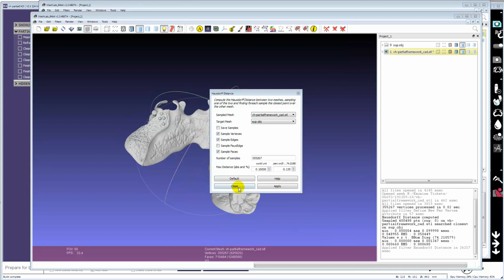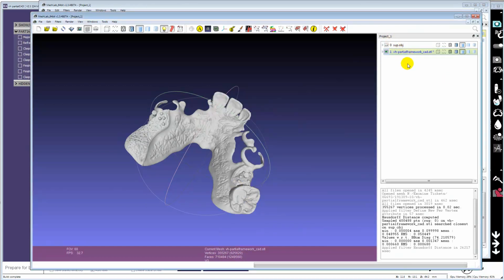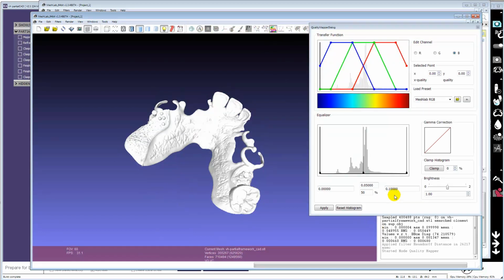Okay, it's done now. So now you make sure that's selected still, which it should be. You click on the psychedelic bunny, and then here, this histogram is actually pretty useful. So now you see in the range from 0 to 100 microns, you see that most of the offset is occurring just a little bit over 50 microns. So it should look about half of what it was before.